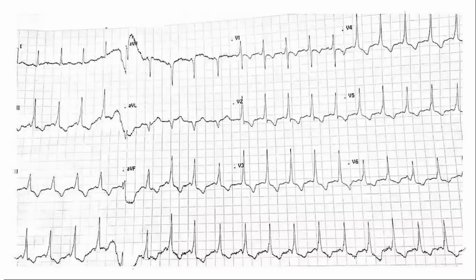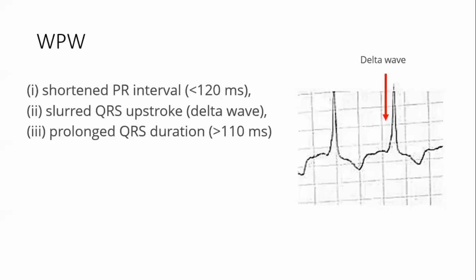These signs were seen after a few moments on repeating the ECG. So this was a pathway. Don't confuse it with PVCs.